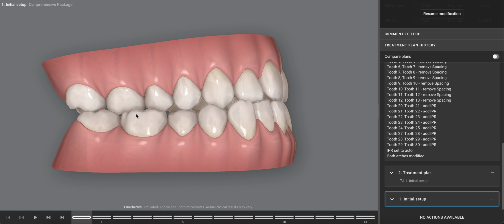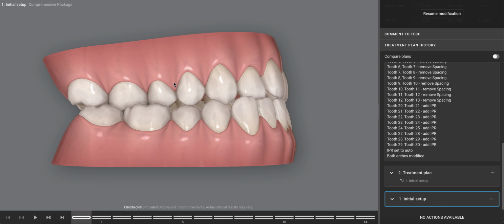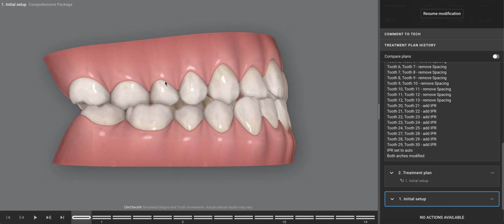What's the word I'm looking for? Somewhat non-pathologic way, meaning they are there now. We don't see a whole lot of wear. Why are we going to try to move them? And I say not a lot of wear. There is a wear facet here, so there are some things going on, and the patient's young, so maybe there is a slight biomechanical risk here. With that said, the patient made it pretty clear. Posterior teeth movement is not really what she's looking for.